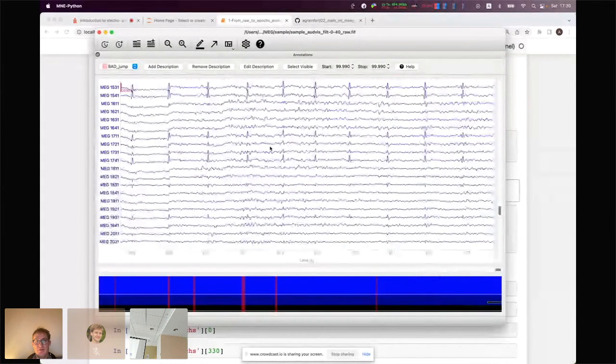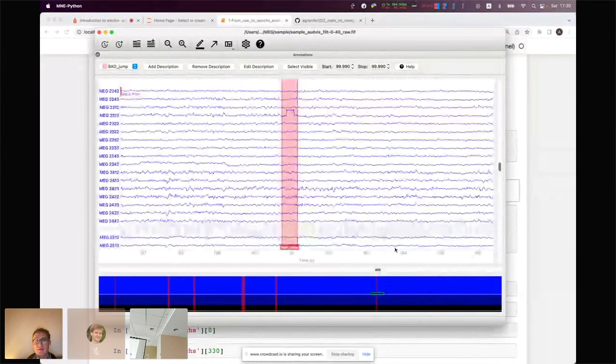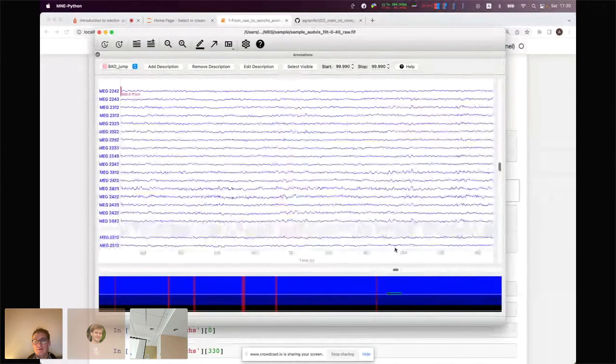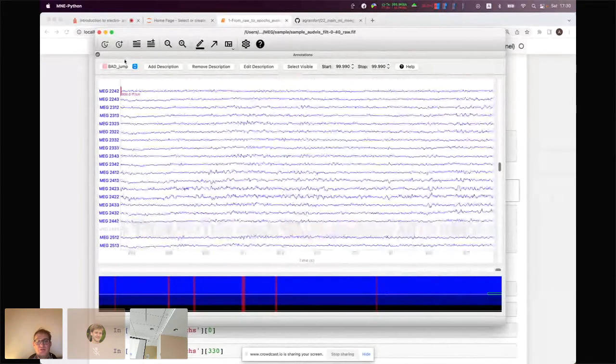Let's see which channel it was. Okay. Okay, it seems it's it for the flux jump. You can do the same thing, bad for EOG.